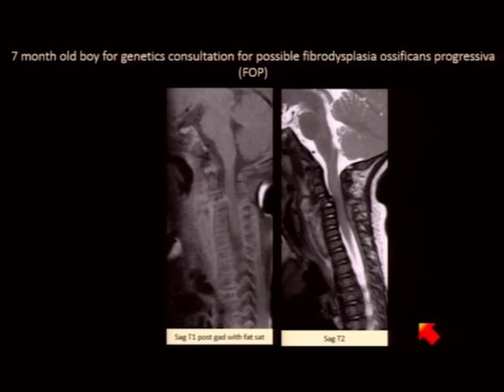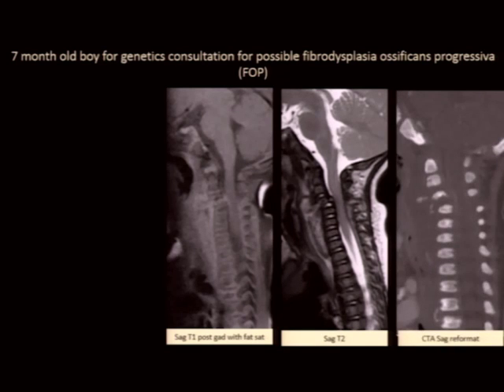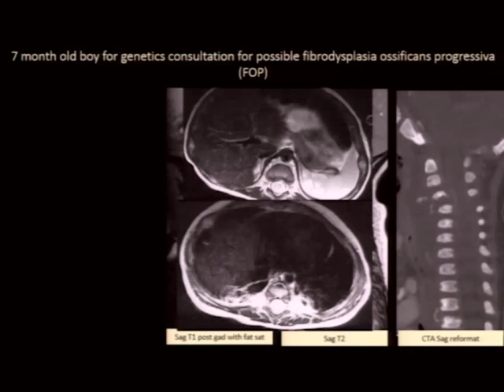At the time of initial imaging, this child also underwent a CTA to look at the involvement of the cervical arteries by the suspected mass, and that showed the fracture dislocation of the cervical spine, the calcium or bone formation within the myositis ossificans, as well as additional fractures of the lower thoracic spine and myositis ossificans lower down. The axial images of the spine were also notable for bilateral fractures of the ribs.